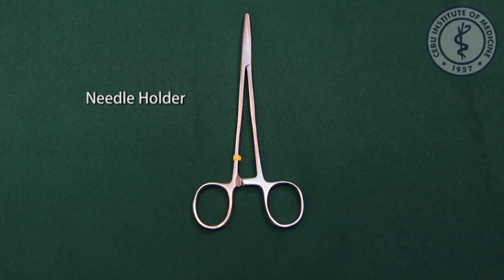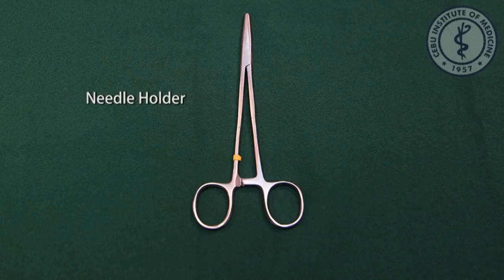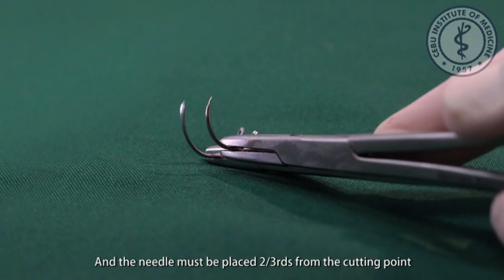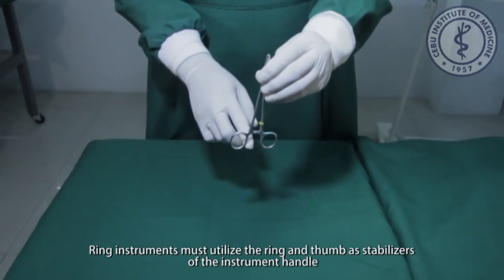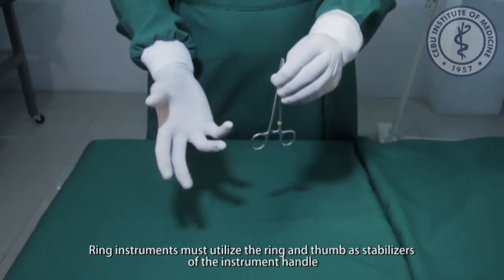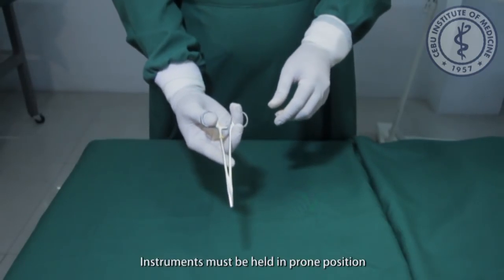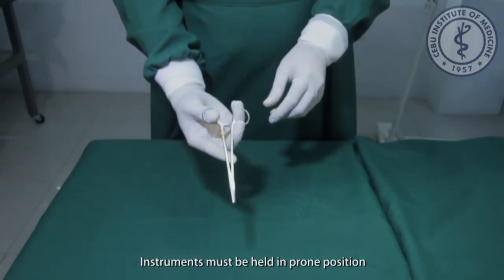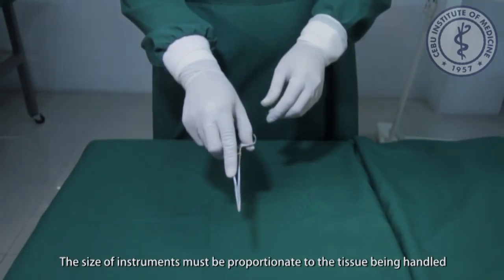Needle holder must be held in a tripod or palming technique, and the needle must be placed two-thirds from the cutting point. Handling of surgical instruments. General guidelines. Ring instruments must utilize the ring finger and thumb as stabilizers of the instrument handle. Instruments must be held in prone position. The size of instruments must be proportionate to the tissue being handled.